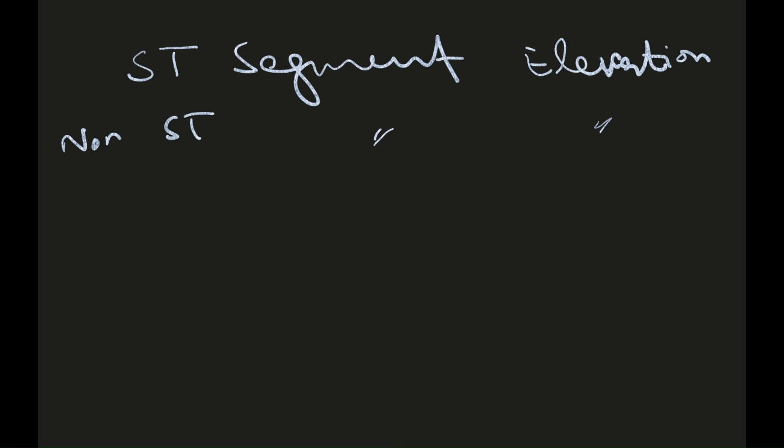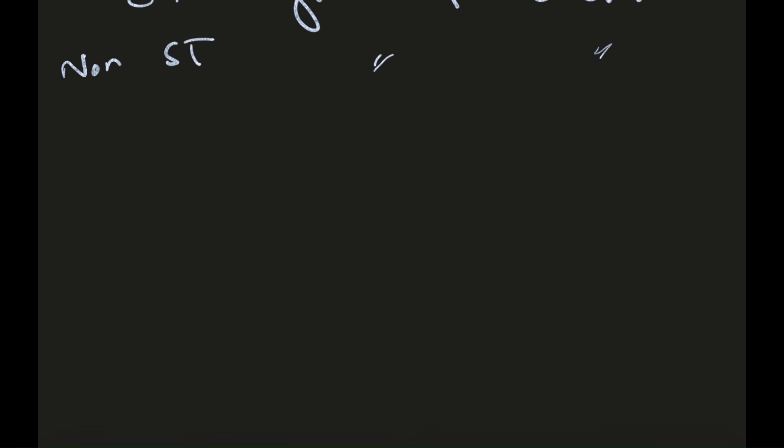The elevation or the depression of this segment is interpreted depending upon the age of the patient, gender of the patient, and the leads. All I'm going to tell you is what is ST segment elevation and what is ST segment depression. Let's put it in simple words.